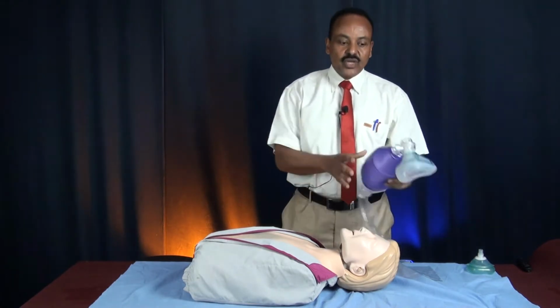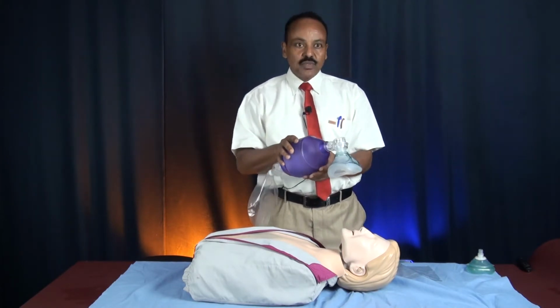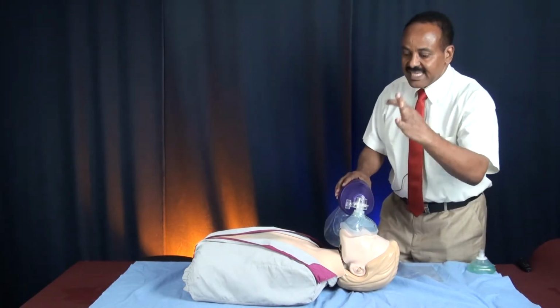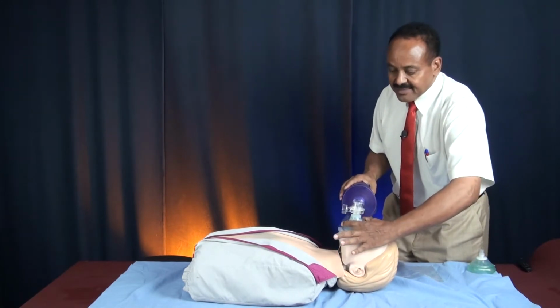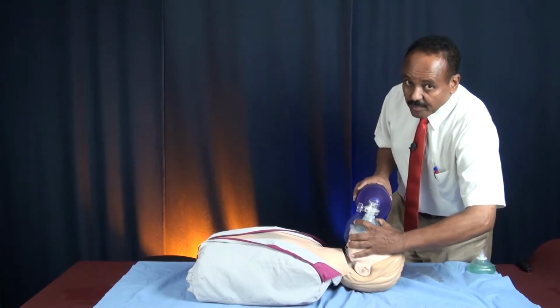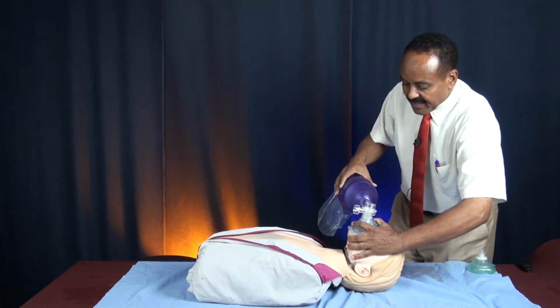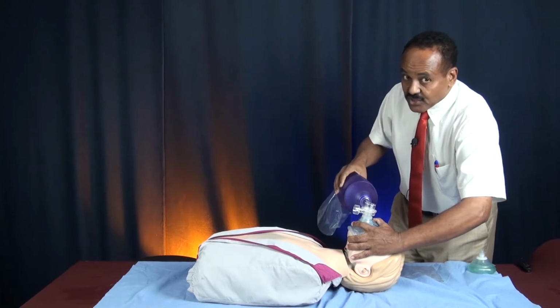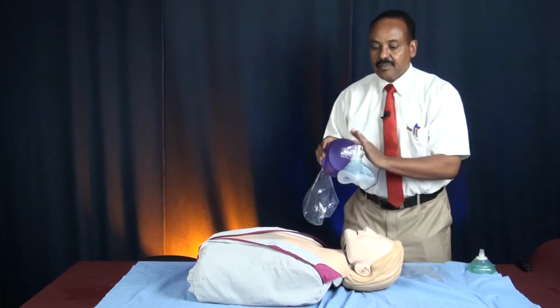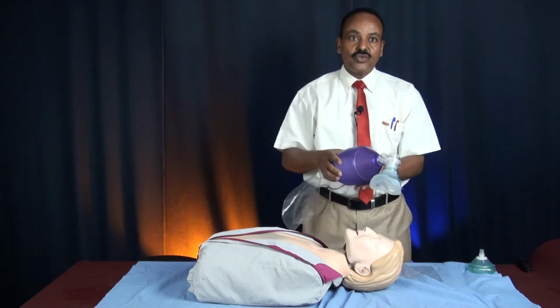Another barrier device is what we call the bag valve mask. When you are using this, usually in hospital by healthcare professionals, you should be at the head of your victim, using the CE technique. C for the mask, and E, you are holding the chin and opening the airway like this. Your right hand squeezes the bag and gives a press, watching for chest rise. This is a bag valve mask, usually in hospital, sometimes with air and sometimes connected to oxygen.